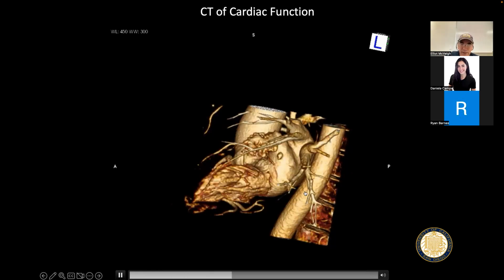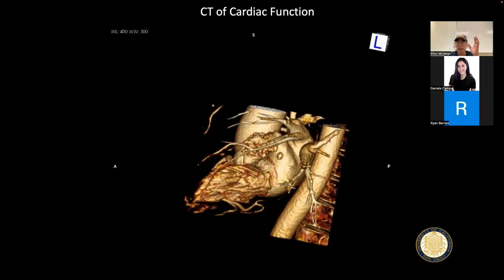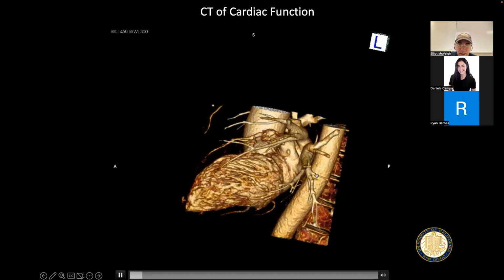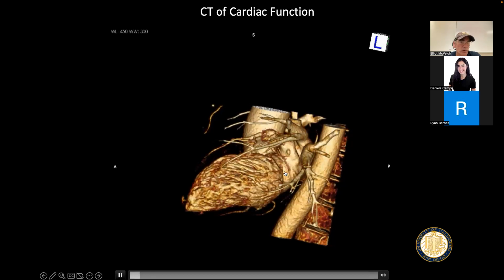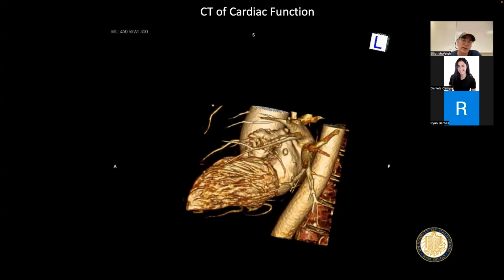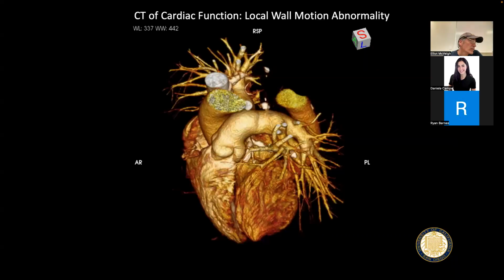And so this is the native smoothness of the data. If you were to look at the bumpiness of my data, if the actual input is something really smooth, that's the bumpiness right there, and that's the noise sort of bumpiness. Here's the ascending aorta, same thing. And the atrium has quite a smooth surface. It doesn't have this trabecular tissue in it. The right ventricle and the left ventricle do have highly trabeculated tissue, and so you can track them. It's nice to see that it looks like they're striated in the direction of traction.